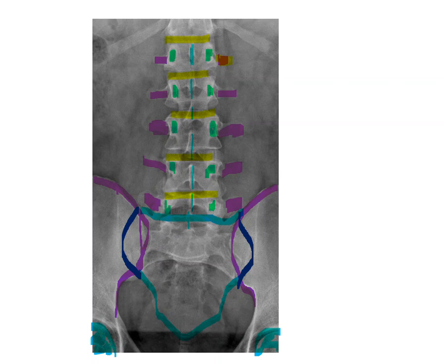So all of those things that I just mentioned, transverse processes, pedicles, SI joints, the femoral heads, the ilium, even the ala of the sacrum, which would be this area in here, that's actually called the ala of the sacrum. The two ala, the right and left ala, should be symmetrical. And all of that is telling us that the patient was not rotated when we took the x-ray.